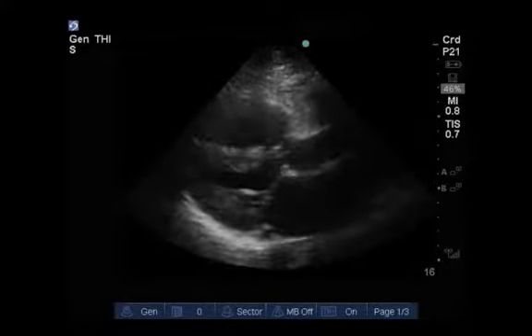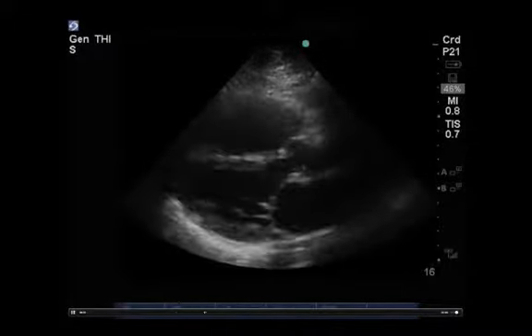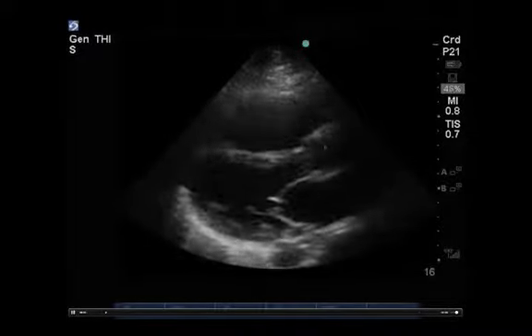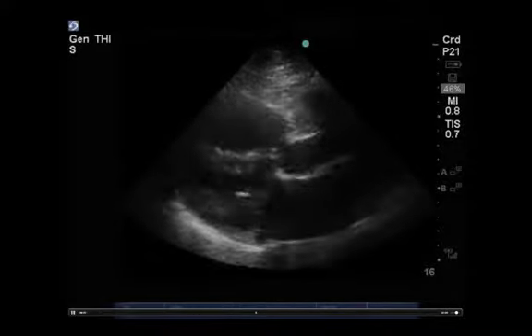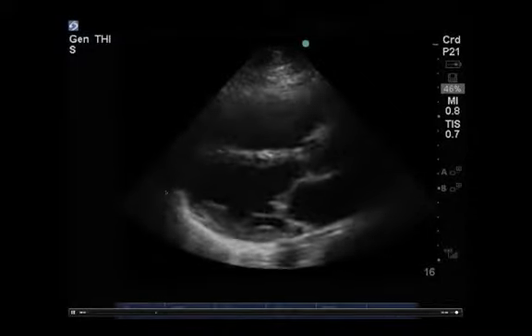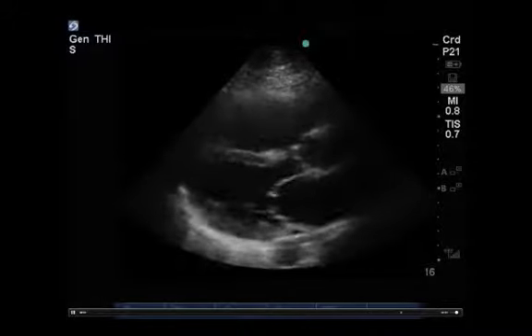More 2D assessment here. We see another parasternal long axis view. We see the aortic valve, not quite as thin and pliable as the initial clip we saw. We see the right coronary cusp is opening reasonably freely, but the left or non-coronary cusp appears to be a bit more calcified and perhaps more fixed. Unclear clinical significance, but all the same, we're using our eyes to address this.